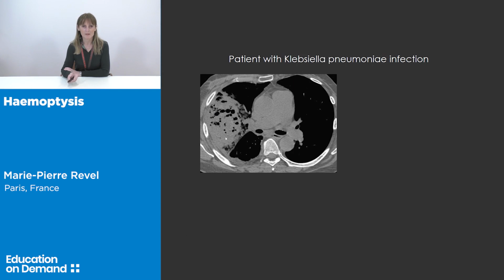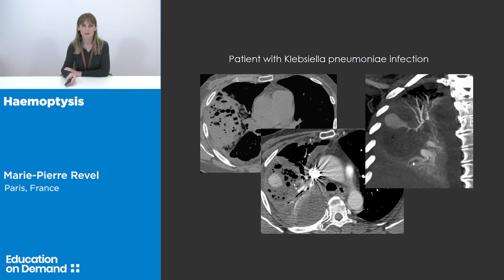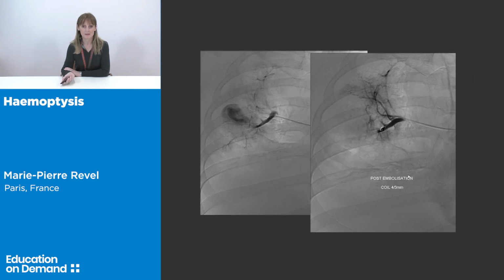all these cavities, my recommendation is to use contrast, even though the patient has not presented any episode of haemoptysis, because in this situation you might depict the presence of false aneurysms, and this allows to preventively treat the patient by selective embolization to avoid a very severe bleeding episode.